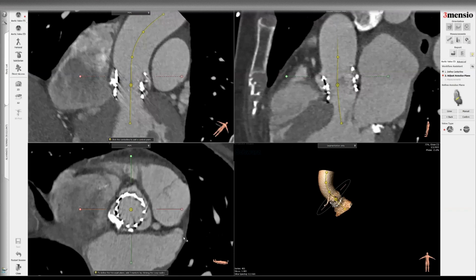The other thing we typically ask for is the intra-procedural aortic angiogram or procedural fluoroscopy, to get an idea of what happened during the initial procedure, and to assess the implant depth and potential redo TAVR feasibility just from that final aortic angiogram of the aortic root, because often you can see whether redo TAVR is feasible just by that.